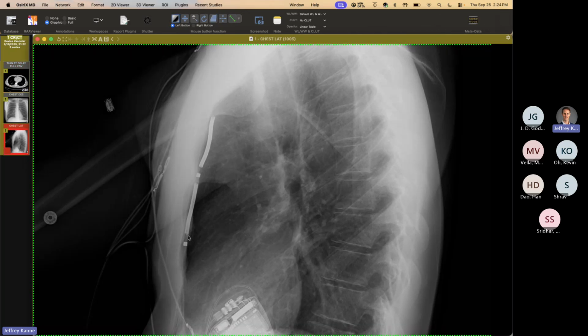They put it retrosternal. So when they removed the old lead, the reason they had to cut it is because there were heavy calcifications all over the lead because it had been in for about a decade or so. So I suspect they just embolized when they were trying to remove it. And so those are embolized calcifications on the actual original lead.